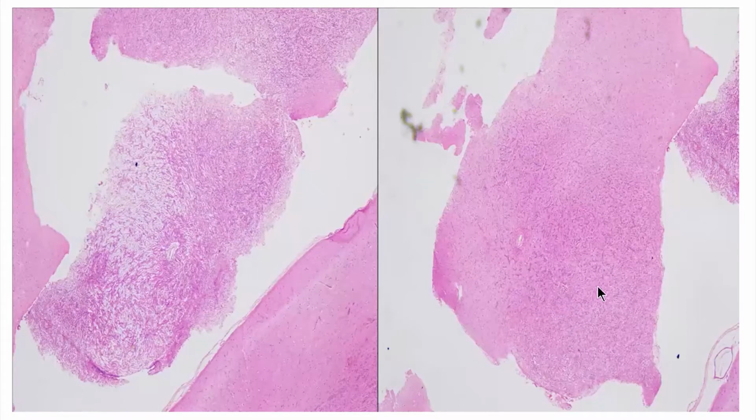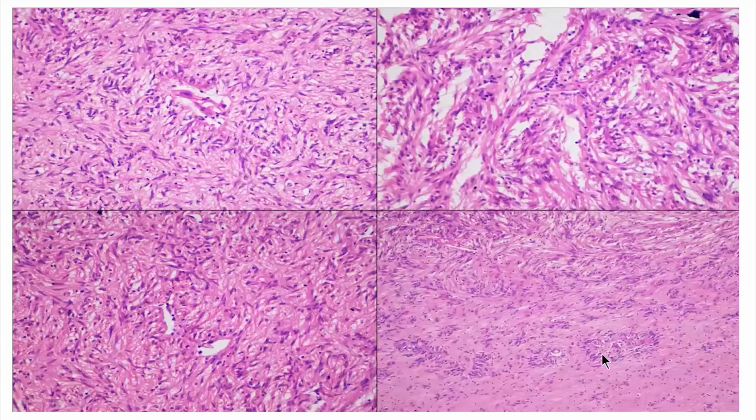Going to the high power, this is a very, very beautiful picture. This is the junction of the tumor. See, this is the tumor and this is the white matter area. In the center, we can see a vessel, and this is a multi-layered sleeve of the tumor cells. This is again a multi-layered sleeve of tumor cells. So basically, the tumor is infiltrating out of the main tumor nodule, but very minimally. And after this, we don't see any sort of infiltration.